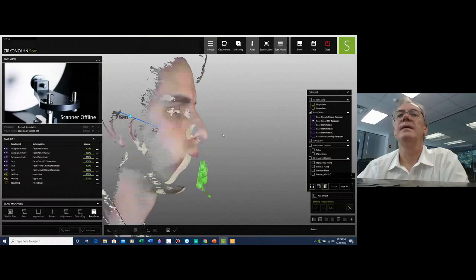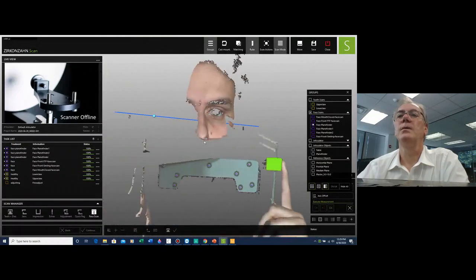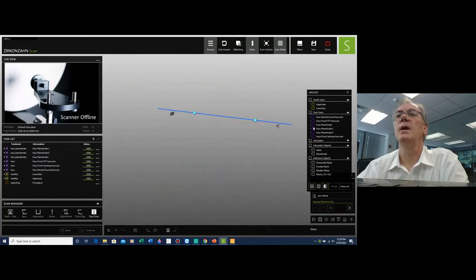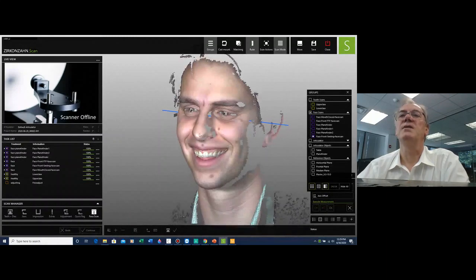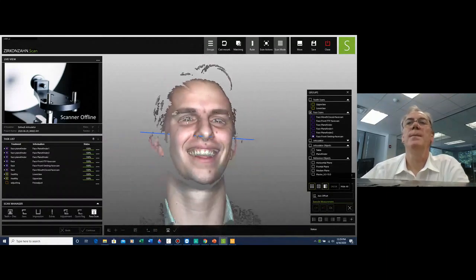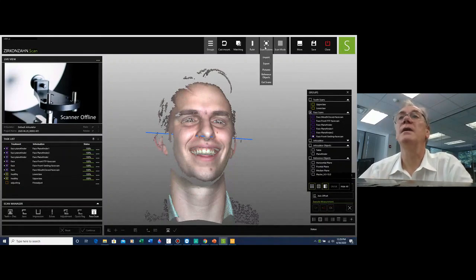We have the face transfer fork. We have the plane finder, 1, 2, 3, and we have the smile. These are the images we brought into our workflow, and we will utilize these images to verify that our mount is performed correctly.